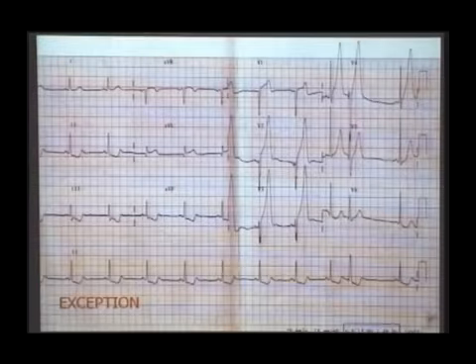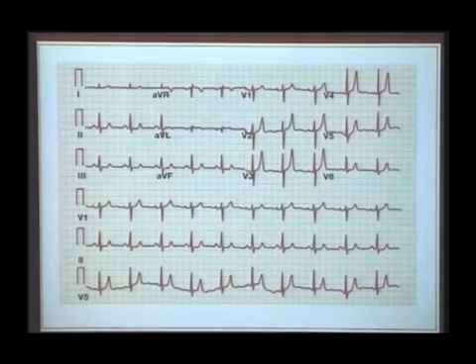You compare the previous ECG here. See the base, see the apex. See the base here, see the apex. So nicely you can see, once you look at this T wave, you know it is hyperkalemia. So look at the contour. Whenever tall T wave, broad base blunt apex is ischemia, narrow base sharp apex is hyperkalemia. Two conditions which can produce the tall T waves.